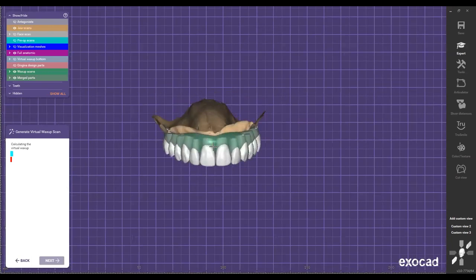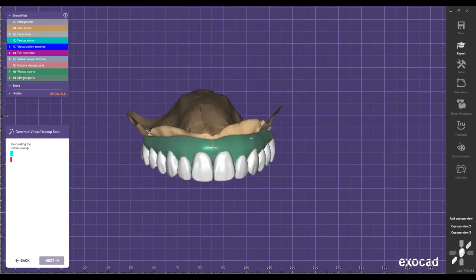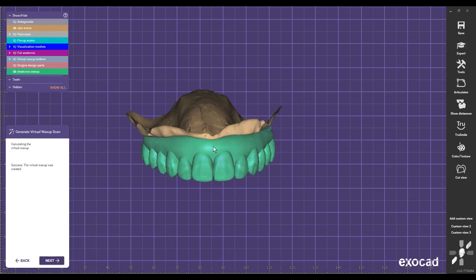So once you start applying these techniques and ideas, it makes everything so much easier, especially for these cases, right? Because the goal is to do a nice, beautiful setup and a beautiful smile, not just an okay smile. Because remember, in the U.S., patients are paying from $30,000 to $50,000 an arch. I want to make sure that if I'm paying $30,000 to $50,000 an arch, I get beautiful teeth, right? It's going to be worth it.